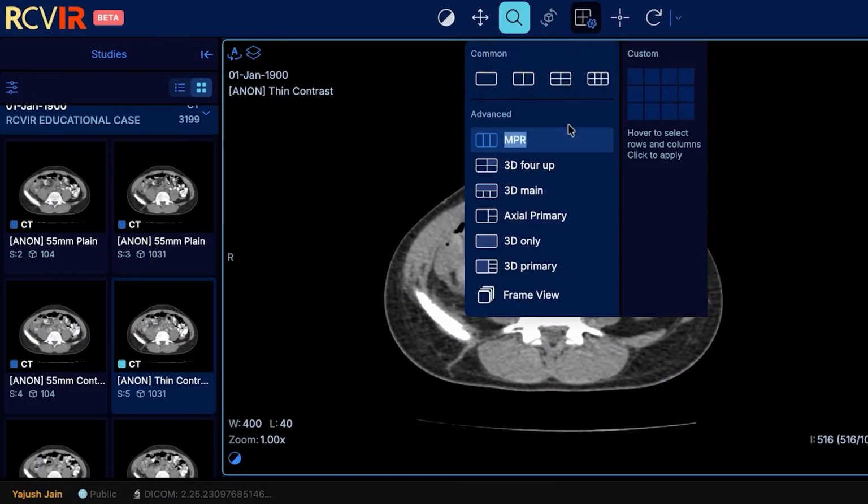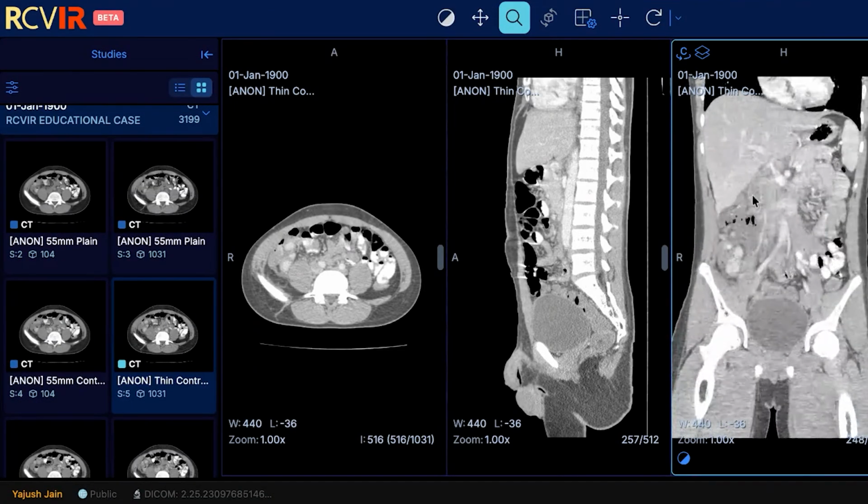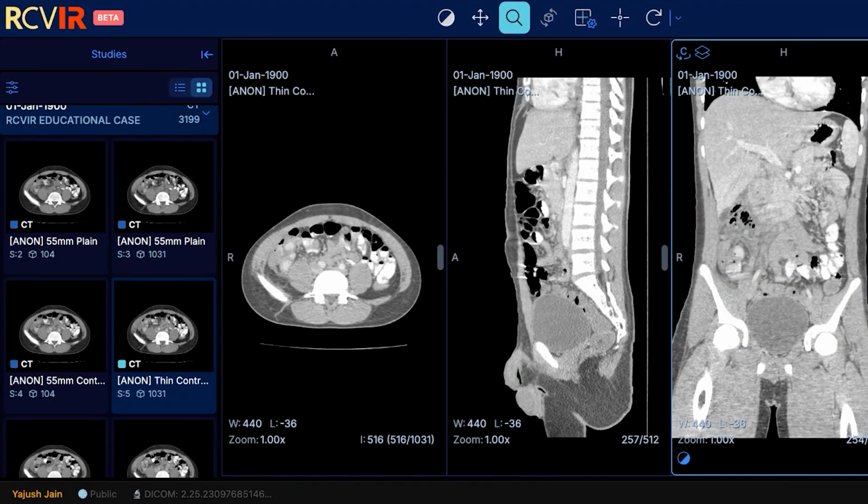Much better seen on an MPR. You can see that the air is trying to go up, but as I said, this is a very early stage scan, and not too much air has leaked from the appendix. Sometimes what happens is that just after the perforation, the omentum also tries to cover that perforation, and it might seal off on its own. But we don't want to take that risk. We don't want the patient to land up in massive peritonitis thinking that the omentum will do that.